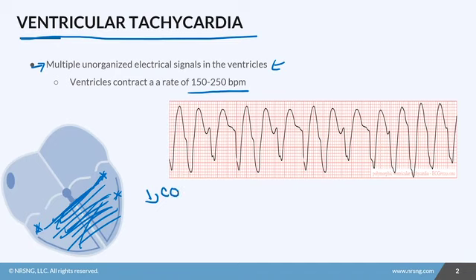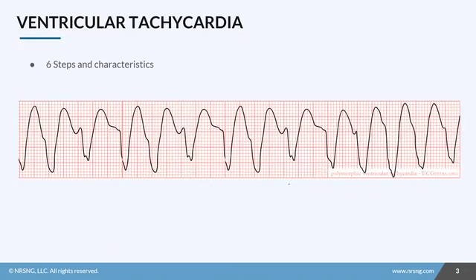Sometimes when people have VTach, they may or may not have a pulse, and that is the first thing you need to check when you see this rhythm. So let's break down the characteristics of it on an EKG.